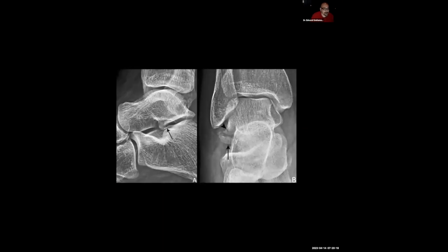Here, showing a couple of radiographs. Radiographically, these lateral talar process injuries can be quite difficult, but I tried to select the best case for this talk. We can see what's been called the V sign. Normally you want to see a sharp V comprised by the projection of the lateral talar process. When you see that it's disrupted, you want to look at your frontal or oblique views of the ankle. Sometimes you can see a little corner defect, but here obviously is a big lateral talar process fracture with obvious involvement medially, so it's likely involving the posterior subtalar joint, with intra-articular involvement.